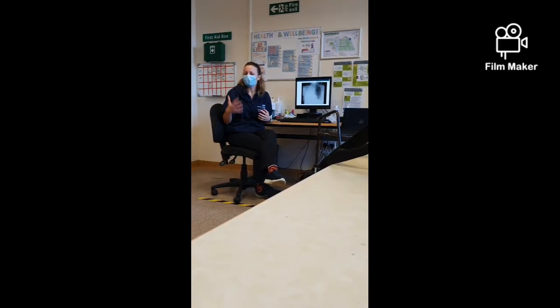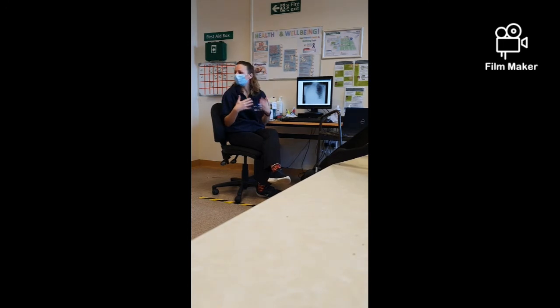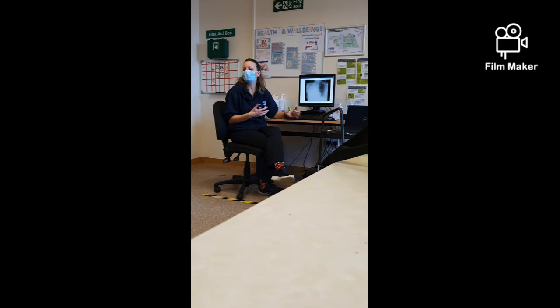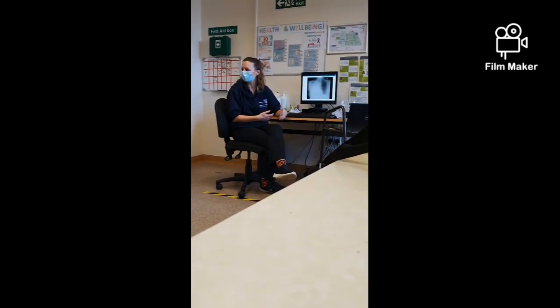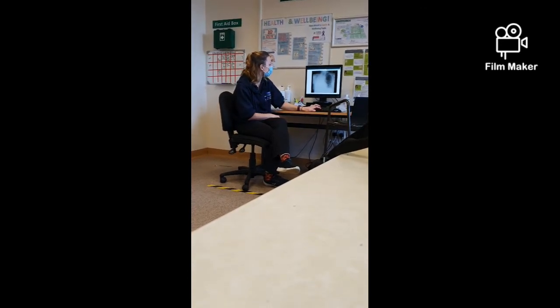Okay. The thing with chest X-rays is, there is a systematic process and we go through that process, but sometimes some things aren't as obvious, so it's all about practice and just going through that approach every time, and then asking, if you're not sure, asking that question. And it's not something that you always get straight away. You just need to consolidate that knowledge and that experience, and then you will be able to pick up things a little bit easier.